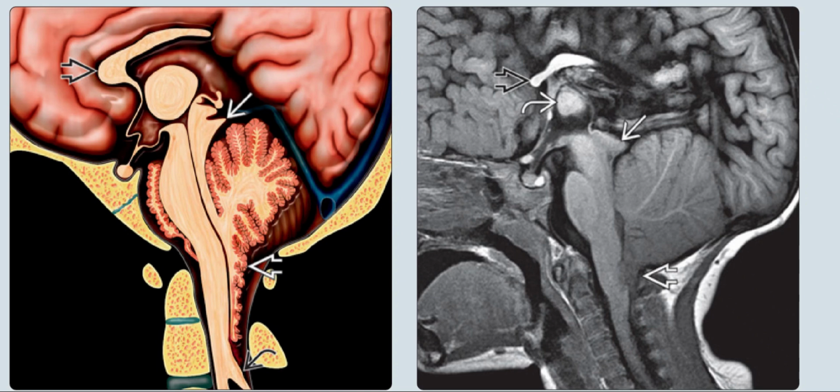So, coming towards Chiari-2 malformation cases, in the left image, we can see that that's the sagittal graphic of the posterior fossa and upper cervical spine, which demonstrates the characteristic findings of Chiari-2 malformation, including the callosal dysgenesis, the tectal beaking, the small posterior fossa, vermian ectopia, and medullary kinking. The right image shows the sagittal T1 weighted MRI sequence. It shows the characteristic Chiari-2 malformation findings, that is the tectal beaking, the vermian displacement through the foramen magnum, the large massa intermedia, and the dysplastic corpus callosum.